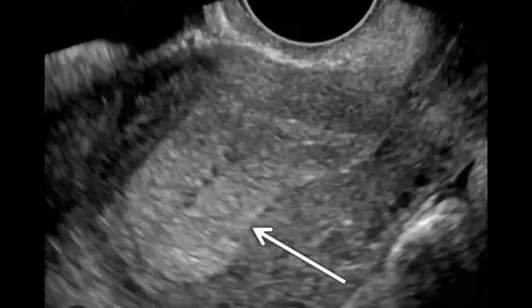If there is another abnormality within the myometrium, you may think this might be because of some carcinomatous response. As far as metastatic deposit is concerned, in that case you may think of metastatic deposit from the ovaries, the fallopian tube, and the cervical region.